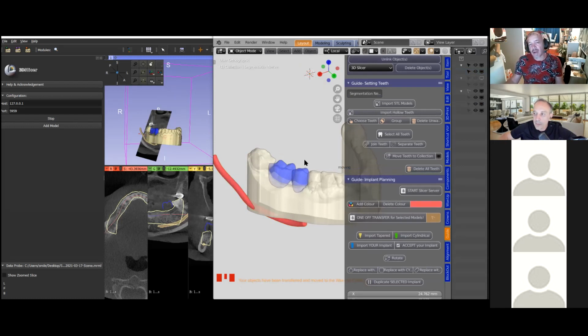Yeah, you can lock it. It's a good idea to lock things, because often it has happened by mistake. You can move things by mistake, and this is critical. Wolfgang, good point. But at this stage, we can't select it at all because it's in a collection which is disabled. You can't move it.